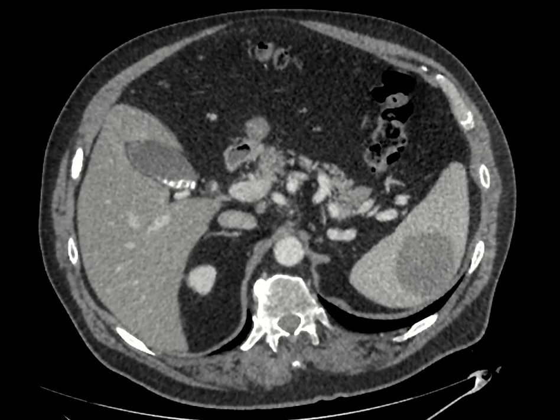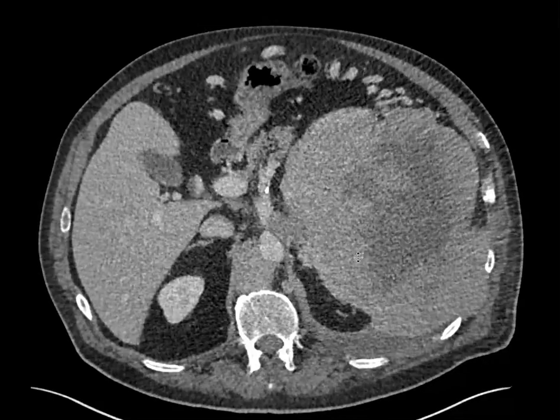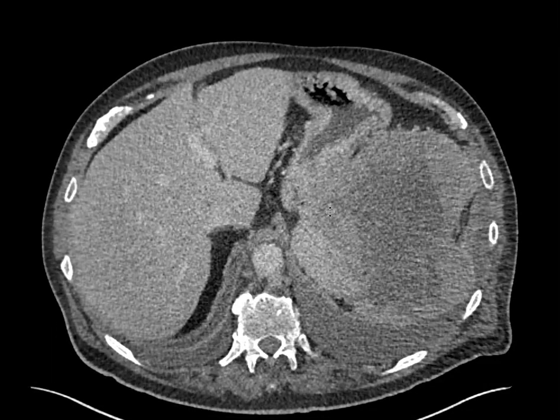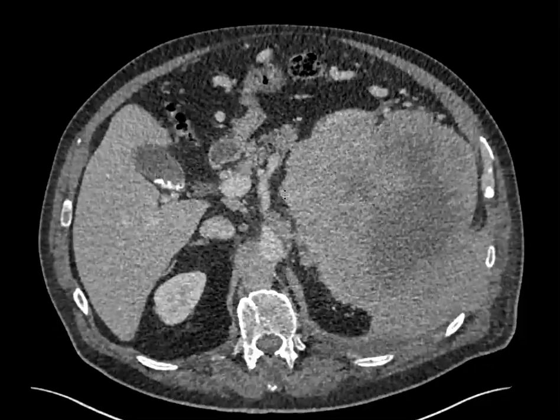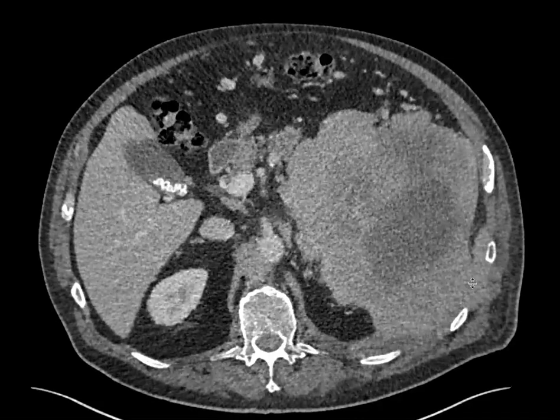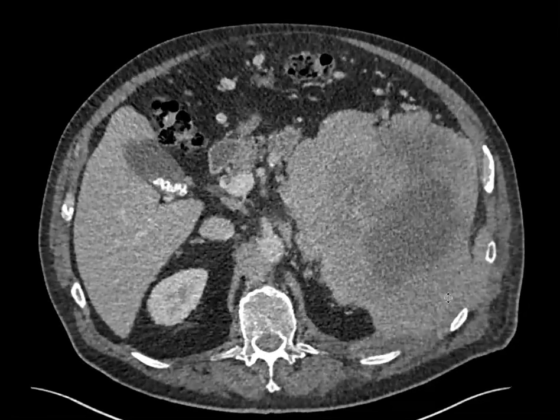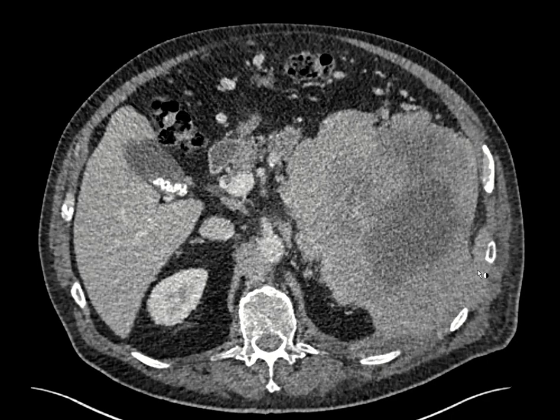The patient ended up coming back a little while later and was having abdominal pain at this point. And now you can see that this mass has exploded in size, is now involving the entire portion of the spleen, is extending out into the splenic hilum here, and you can see it actually involving the left wall of the chest, going in between the ribs. You can see that there's soft tissue density going there as well.